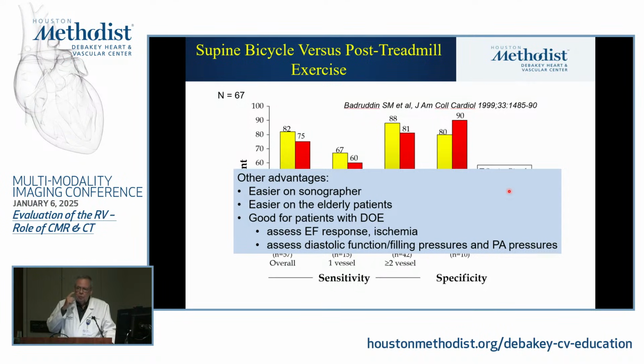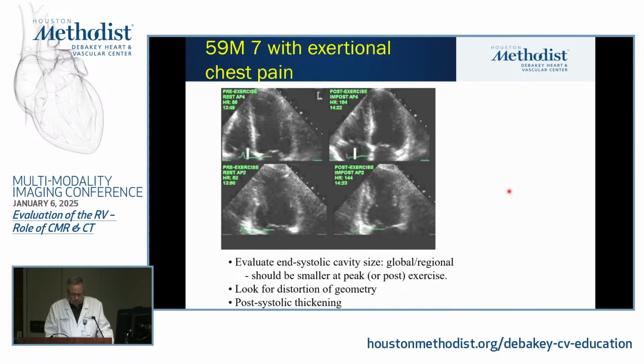In addition, when you're doing your comparison, you don't have to compare only to rest. In fact, the best comparison is your peak stress to an earlier level of stress. Because in that earlier level of stress, the heart should actually be doing better, then it worsens with the peak stress. So your eye actually picks it up more easily, because you're comparing to a level that already shows an improvement in function.